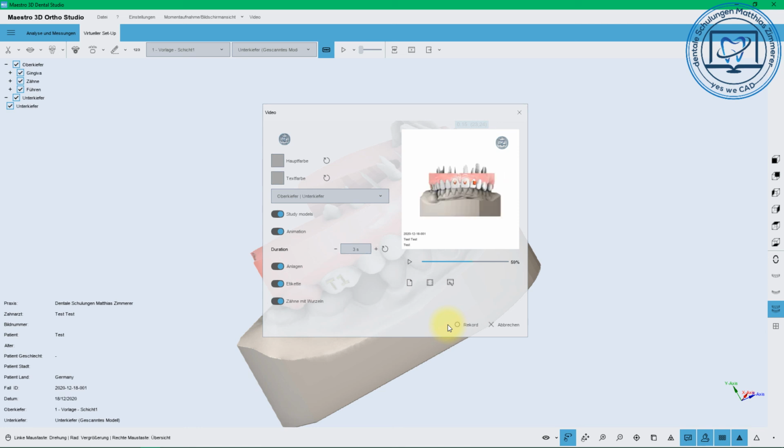If you have a face scan also, it would be shown here, very cool, but at the moment I'm using Android, and the Bellus app is only working on iOS, and the other things are too expensive for me at the moment, so I won't use face scans.